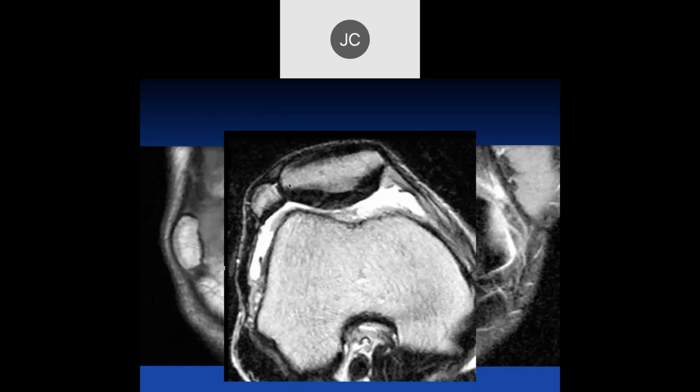Bipartite patellas are much more common than fractured patellas. It's pretty common. It's thought to be a congenital variant, though a few of them may be fractures in childhood that kind of heal without a problem. But here, this is a bipartite patella, typically considered a normal variant.